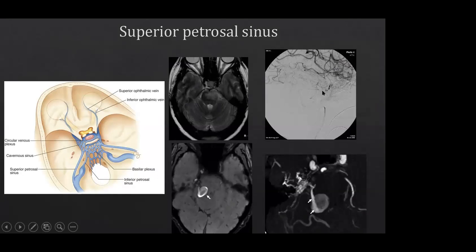And at that time, you can see there was a small venous channel still persistent, a small amount of opacification, residual fistula still there. And that had resulted in flow of blood into the superior petrosal sinus, which had resulted in brainstem venous hypertension. So you can see the effects of incomplete embolization of the fistula and the venous hypertension in the brainstem at that stage.